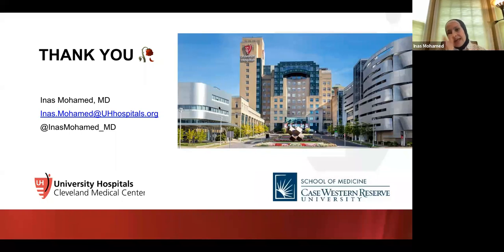It's very good, but in my practice we describe how it looks in each one, and then we give the LIRADS. Yes, and observation is actually what is used in the original paper. Observation is the more official term, if you want to use that lexicon.